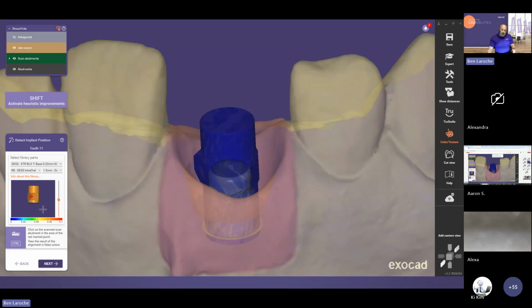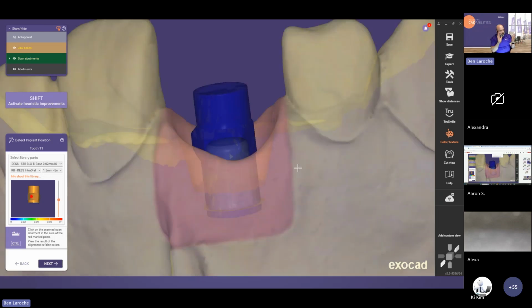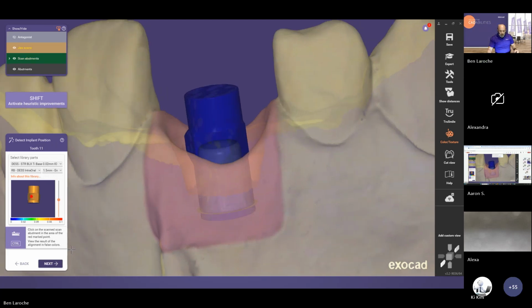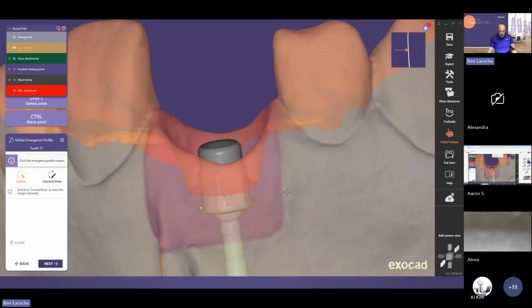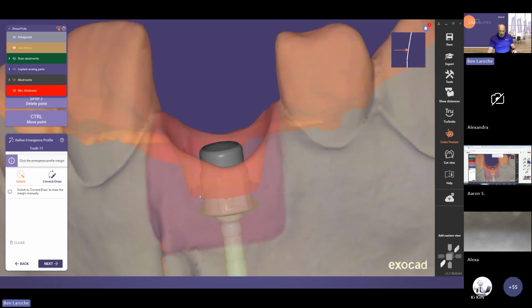When there's scanning involved, we're talking triangles, and then those are linked together. I don't want to bore you with details, but there's always going to be some micro rounding, right? So it's normal to see discrepancies on corners. What you don't want to see is a discrepancy on flats. So the top and the diameter or the radius part of the scan flag is the most important. That will tell you that it's matched properly in height and there's no variation on where it's positioned. Once we've got a perfect match, we hit next. And now you see it's replaced everything and put in a representation of that tie base.